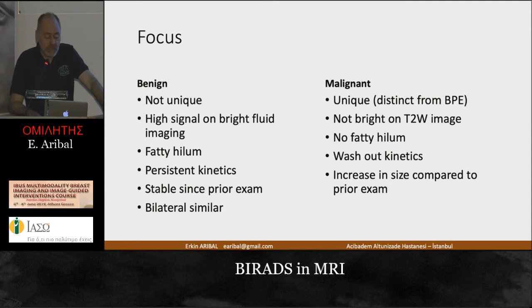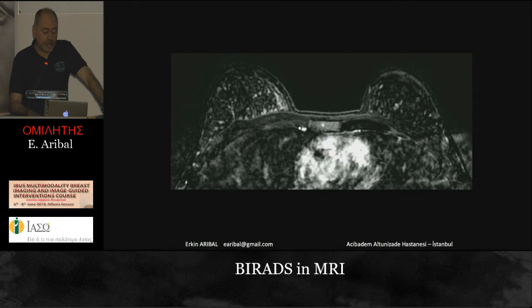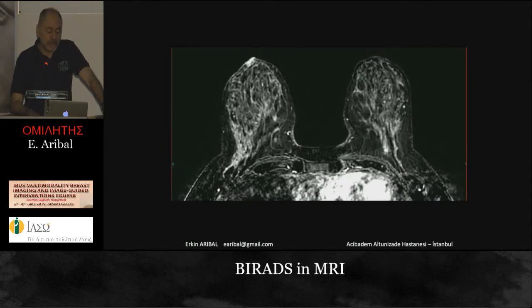They may have washout kinetics. They increase in size compared to prior exams. So this is a background enhancement. You see similar dots in both breast tissue. Again, same, very high background enhancement with some dots which are similar.